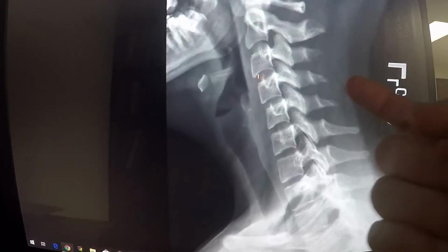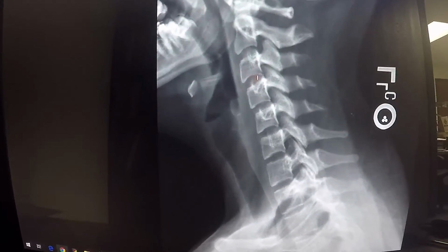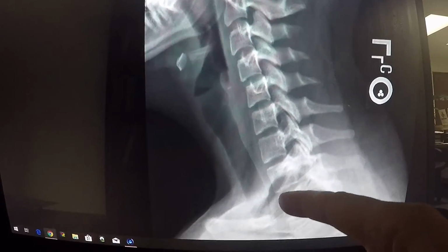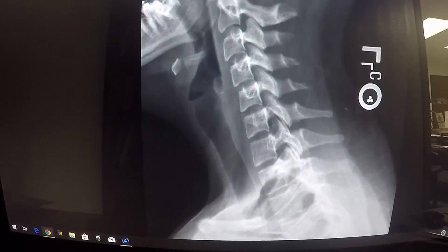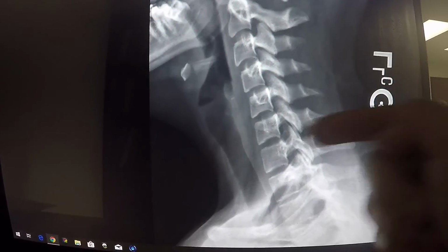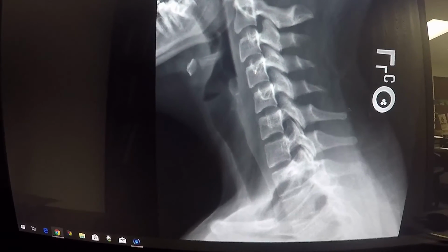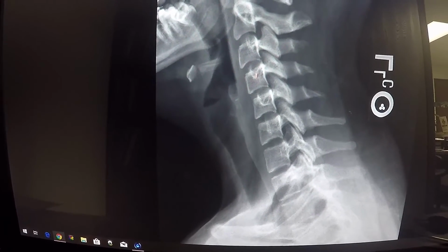Now C5, the bone is actually very subtly bent forward, and that's where you get that military neck starting to happen. You can see a little bit of a development of a curve down here, but right at C7 it stops. So we know we're going to need to adjust the C7 up, forward, and depending on which side is most comfortable for the patient, the best way to determine that is to actually examine the physical patient.